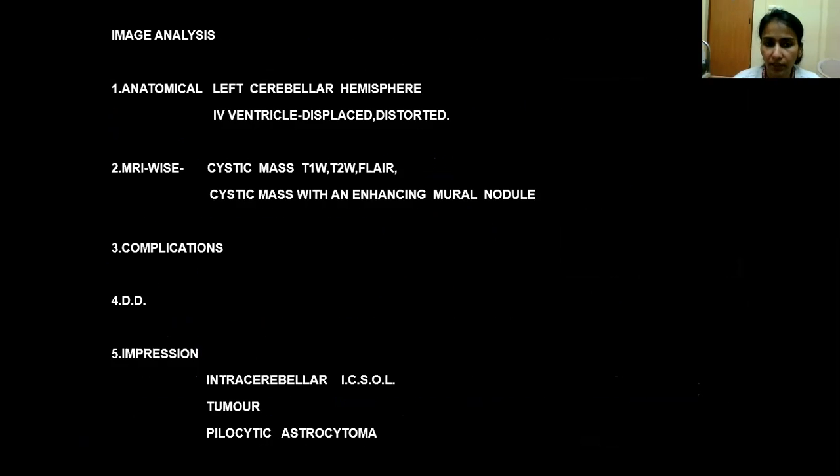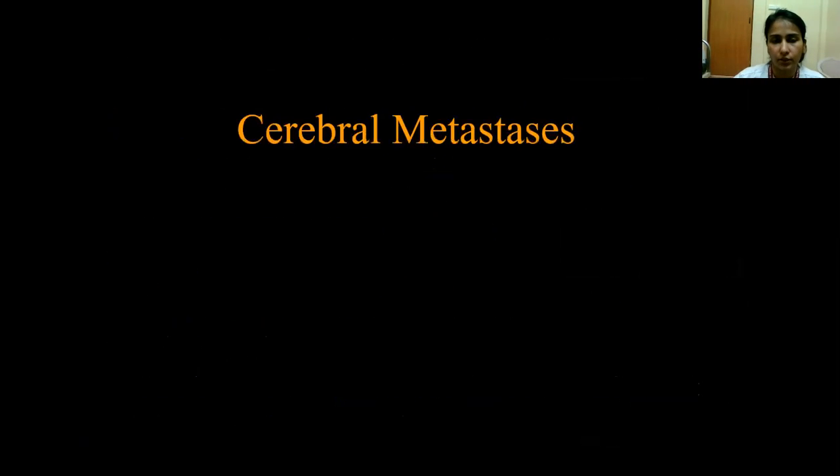Then impression, what are we going to give? There is an intracerebellar, intracranial space occupying lesion, and this is a tumor. Most likely it is a pilocytic astrocytoma. Then we are going towards cerebral metastasis.